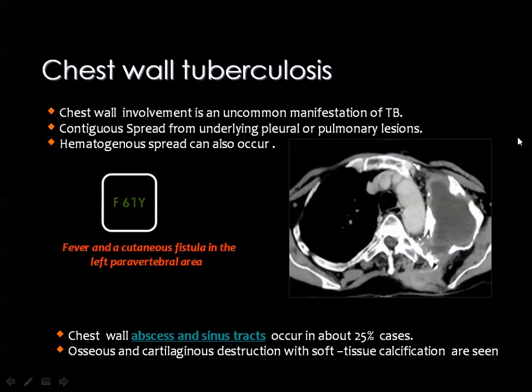You remember that I have said before the relationship between TB and calcium. And I have also emphasized the importance of enhancement of the edge of the pleural collection for the diagnosis of empyema. And whenever you see calcium, you may suspect the underlying tuberculous etiology, but you should remember that calcium can also be seen in other forms of empyemas in the chest or even in the chest wall itself.